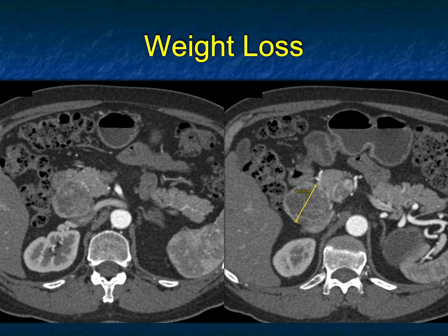And so I would like to see the coronal views, because when I don't see a dilated pancreatic duct and I don't see a dilated common duct, I'm thinking it's coming off the duodenum.